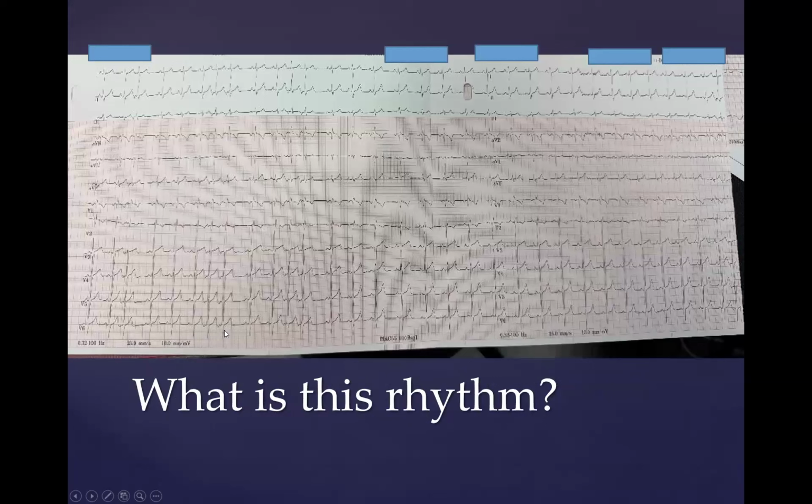So, okay, so this is multifocal atrial tachycardia. This patient is 6 years old, and they come into your office, and this is the very first time you've ever met this patient. So what are you going to do about this now? You're in the clinic, and Robin says, "Boss, I did this EKG, and I saw there were some fast beats, so I ran this rhythm strip for you." And now you're walking into the room with the patient. So what do you want to know? What are you worried about?